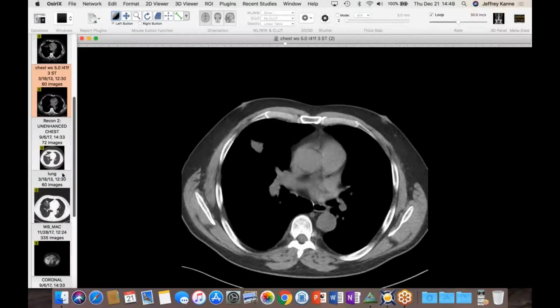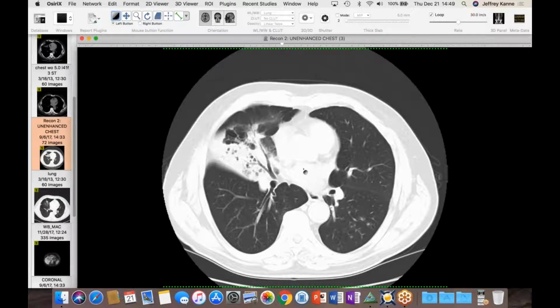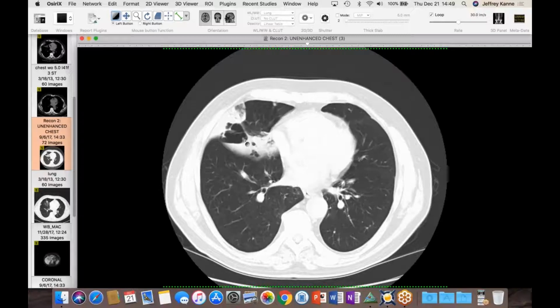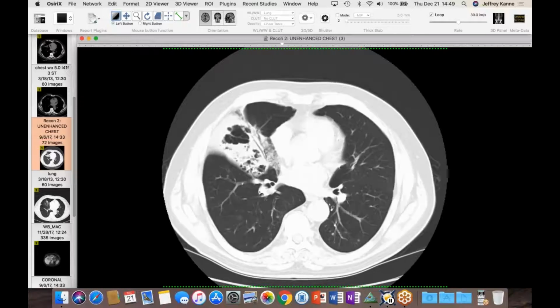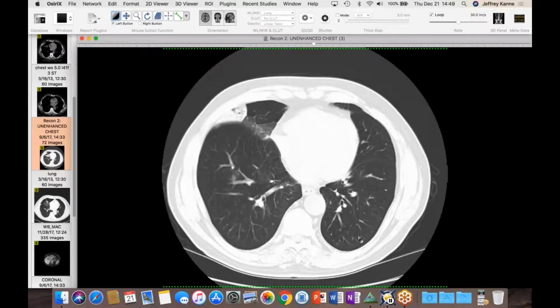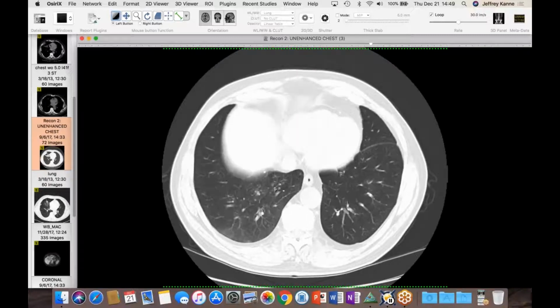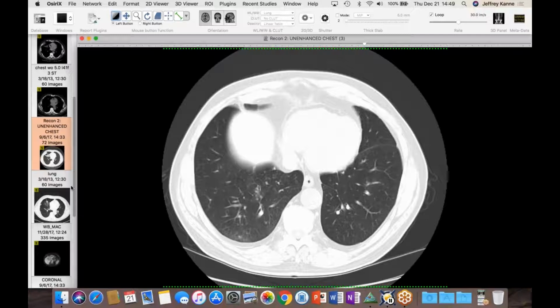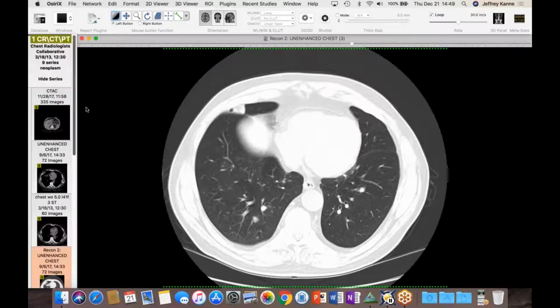So then we have a CT scan from this year that shows what has now developed, and we see this cystic, bubbly fluid collection mass. There's some well-confined ground glass around it, so a part-solid component filling most of the middle lobe. And it's important to recognize these little guys scattered throughout, these little Cheerios. Now, you might say they're inflammatory nodules, endobronchial spread of debris, which is fair.